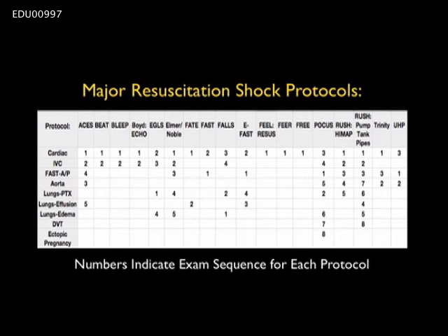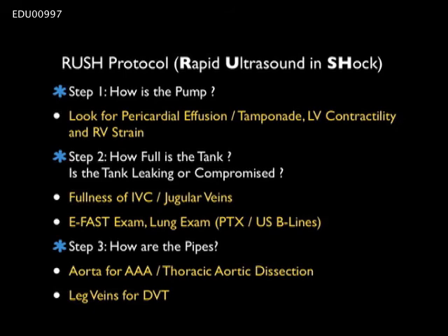To the left, we can see the protocol ultrasound elements that have been combined into many of these resuscitation protocols. And we can see that the RUSH exam combines many of the protocols to date, starting with cardiac and IVC exam and continuing on through the FAST exam, the aorta exam, lung ultrasound, and finally the DVT examination.